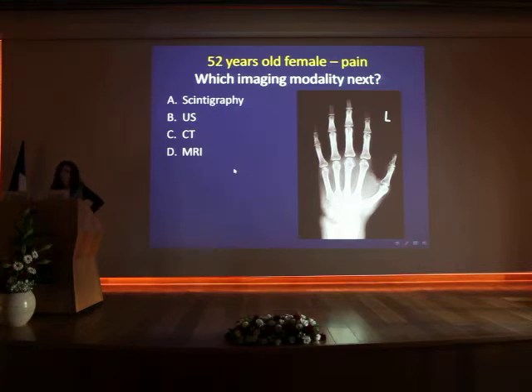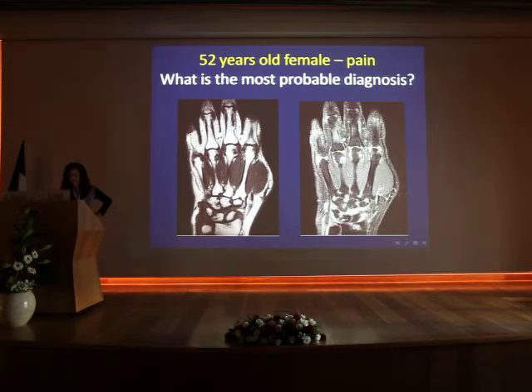I have to say that ultrasound is not a bad option. I think ultrasound for the hand is great, in the right hand or the left hand too. I wouldn't recommend the CT, and MRI is also of course good. And that's the MRI of this patient.